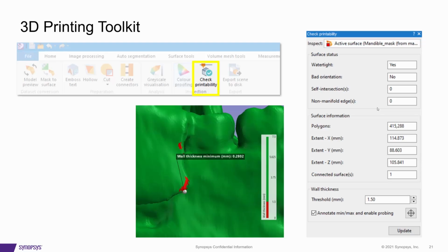Finally, the next one is obviously export. We export all the major formats from 3MF, STL, or OBJ in the Biomedical software. We also export DICOM encapsulated STL back to PACS as well. So all of them should be covered. The 3MF and OBJ obviously support color, the multicolor, and that's all being checked and verified with various print manufacturers.